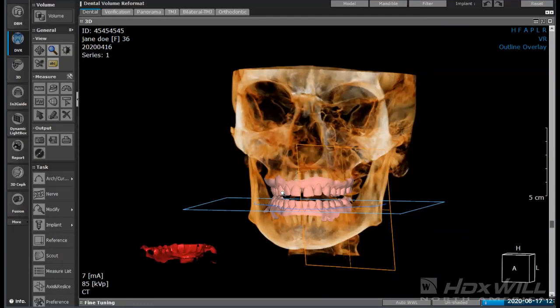It makes the communication easier. And again, in my days of being a clinician, if the patient understood what the treatment plan was, I felt it was a whole lot easier for me to get across what we were going to do, how we were going to do it, and get acceptance of that treatment plan, because you were able to explain it to them in a way that they appreciated. So just to show you some interesting things to put with that as well.